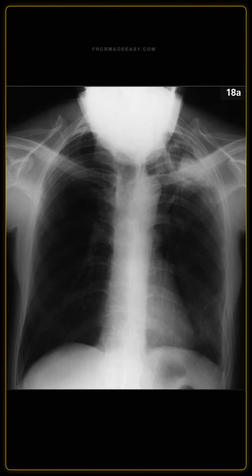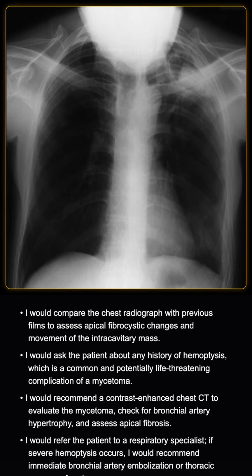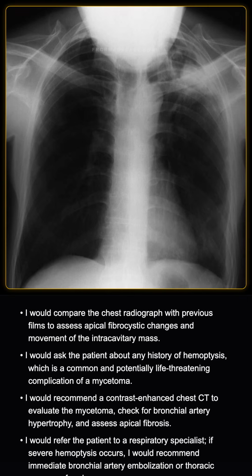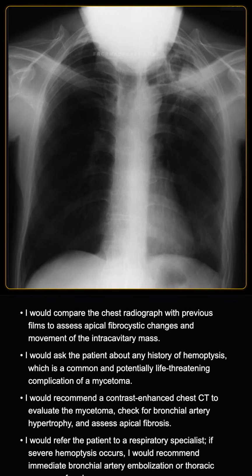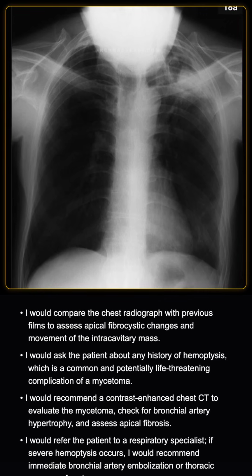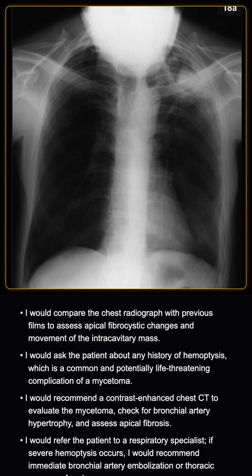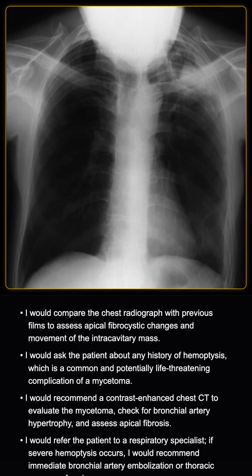How would you manage this patient as a radiologist? I would compare the chest radiograph with previous films to assess apical fibrocystic changes and movement of the intracavitary mass. I would ask the patient about any history of hemoptysis, which is a common and potentially life-threatening complication of a mycetoma. I would recommend a contrast-enhanced chest CT to evaluate the mycetoma, check for bronchial artery hypertrophy, and assess apical fibrosis. I would refer the patient to a respiratory specialist.